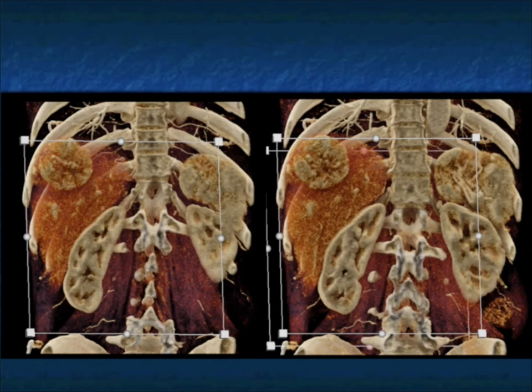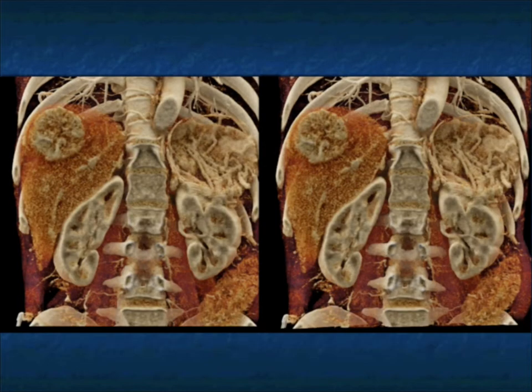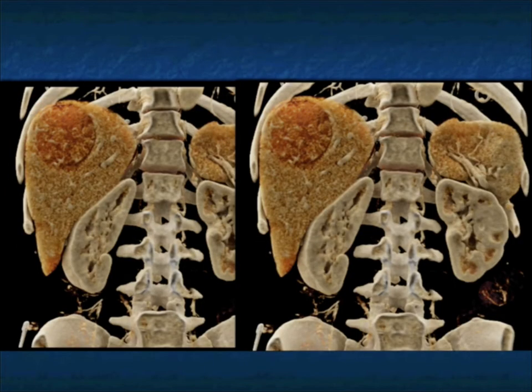You look at this lesion, you say, gee, I should just be able to go in and resect it. And they will try because there were no other lesions present. And that would be a good idea in a patient like this. Again, the preoperative planning, making sure there are no additional lesions, looking at whether surgery can be done, looking at vascular involvement all becomes critical.